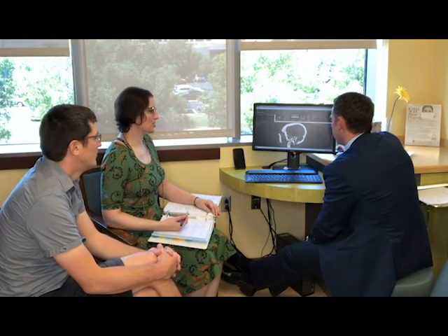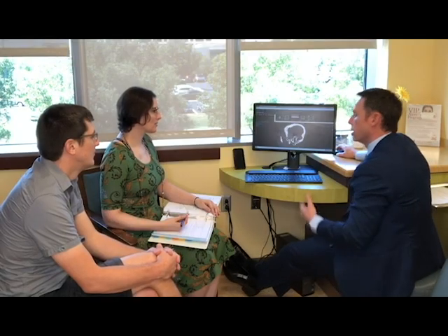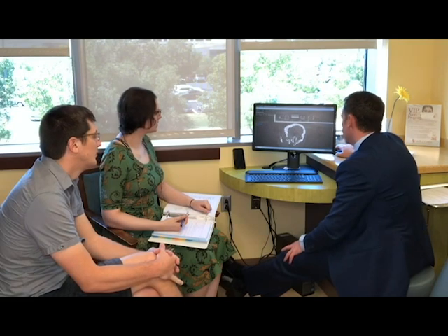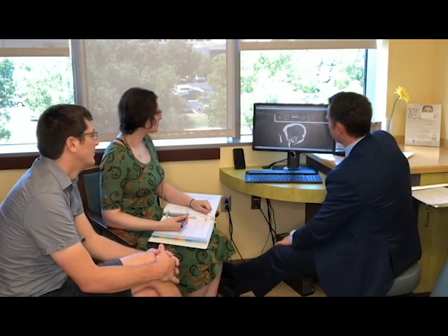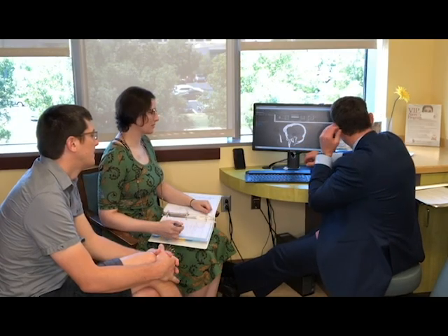So that could potentially be causing some of the pain? I think it's causing some of the pain, and it also has implications for, kind of as a surgical detail, if we go that route. Okay. The other thing you'll see here, all of this, again, this honeycomb appearance, that's the normal appearance of what we call the temporal bone. So on me, that's sort of right here.